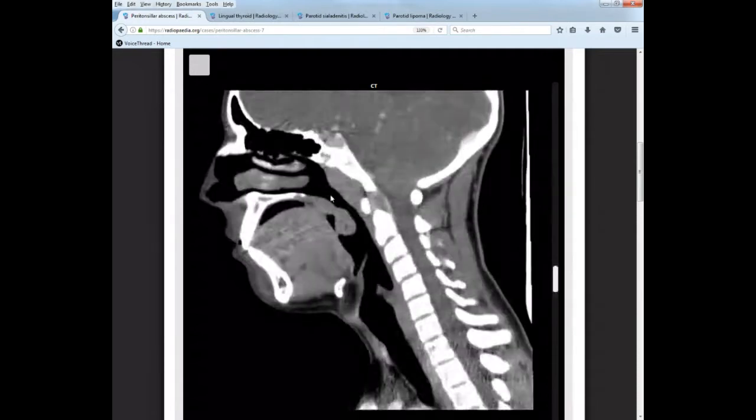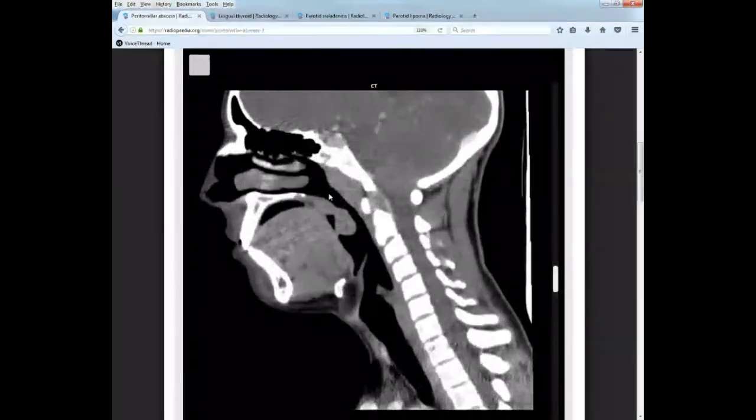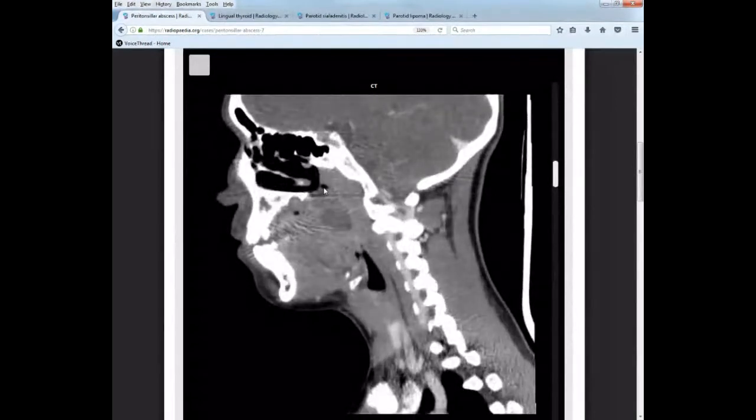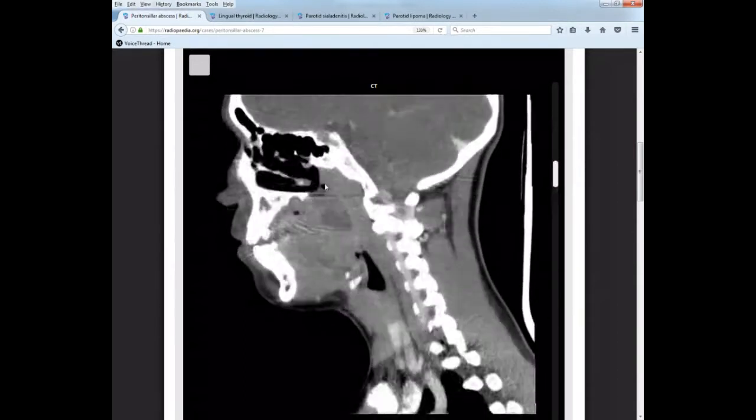You can't see it on the other side. It's not, just the slices are too thick. We can't quite see it. But you can see just the one section here and then the next slice laterally there of the eustachian tubes. They're posterior and inferior to the nasal concha, which you can see here. And then there's your opening.